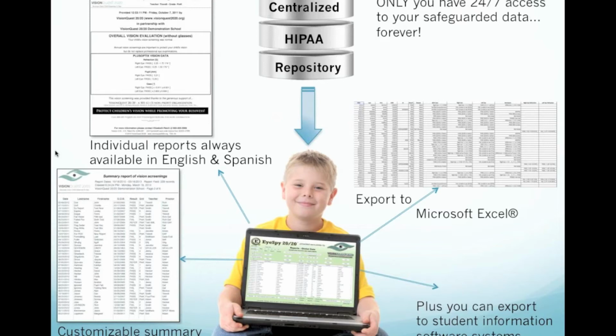And then, of course, you have the ability to export the data into student information systems, which is very nice for schools that are using these MRSs that are now becoming more and more prevalent. So what's an MRS? The medical record systems that schools are implementing electronic records for their students. Not all schools, but many schools are integrating or using programs like Synergy or CHIP. And obviously, I think in Minnesota, there's a statewide standardized program.